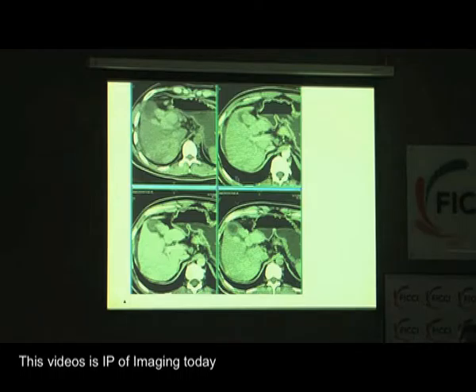So here's a patient with what appear to be multiple mass lesions in the liver on the plain scan, which is what was seen on ultrasound. You see this large triangular shaped area which is hypodense compared to this, and along with that you can see there is a step off due to capsular retraction adjoining this area of abnormality. While these were reported as nodules, it was in fact the reverse, and this patient had normal parenchyma and areas of fibrosis, which on post-contrast images, as you can see on this early arterial phase and venous phase, show a sequential enhancement of the area of confluent fibrosis.